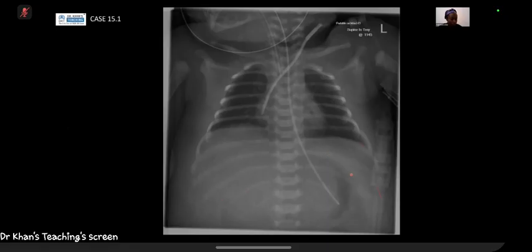What this radiograph is basically showing you, if you ever get presented it in an exam, is that initially you think it's a chest radiograph and you need to focus on the chest. But don't forget to look outside of the chest and at the periphery of the film, because the abnormality might actually be there. This is actually a football sign, which is incompletely imaged because we don't have the whole abdomen on, but this is seen in pneumoperitoneum.